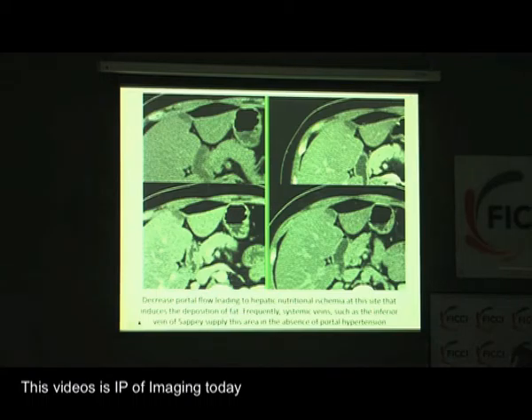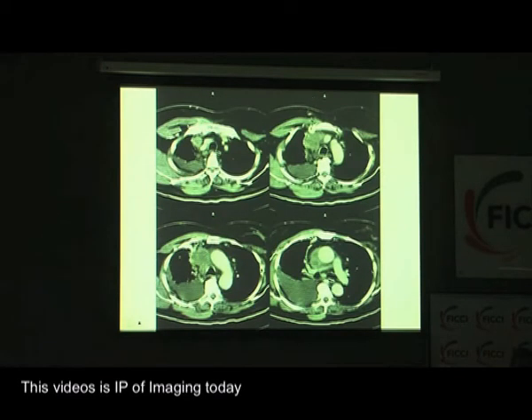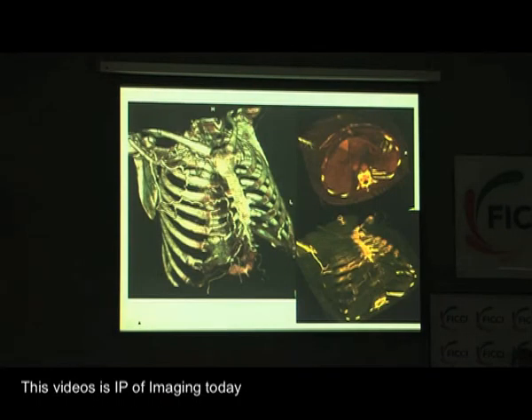So while this appears as hypodense in most instances because there's normal vascular supply, occasionally you can see hypervascular lesions in the liver, and this was a triple phase CT we were doing for evaluation of a liver lesion, and you can see that there is this marked enhancement of this part of the liver. The reason why this was enhancing and the aorta was not was that this patient actually had a mass lesion and a CA lung, and there was SVC thrombosis, and because of that there was collateral circulation actually going to the heart through the venous system and the hepatic venous system.